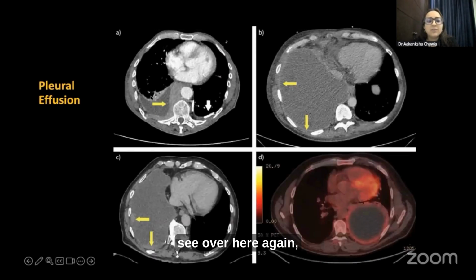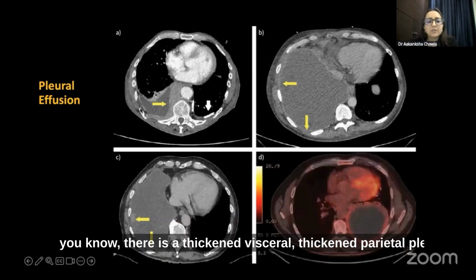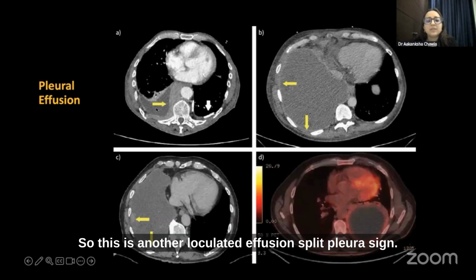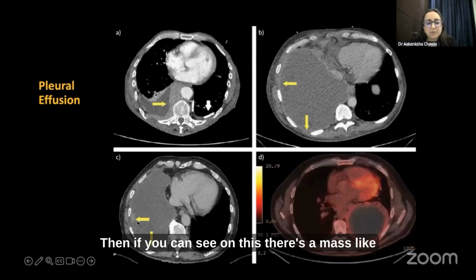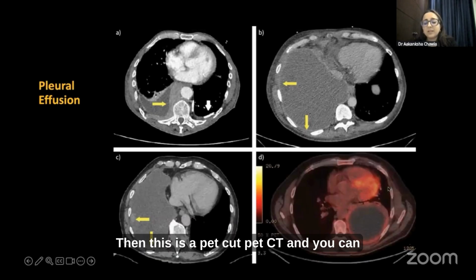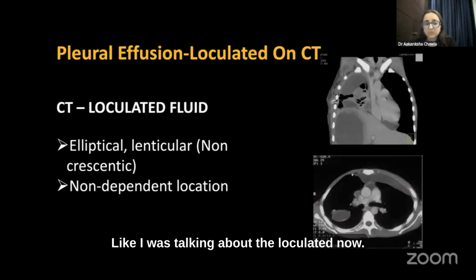Then some more axial cuts. If you can see over here, again, there is a thickened visceral and thickened parietal pleura, there's presence of a mass lesion, and there's fluid in between. So this is another loculated effusion, split pleura sign. Then on this one, there's a mass-like lesion in between. There are some nodular deposits, and there's a large effusion in this CT cut. Then this is a PET CT, and you can see an enhancing, well-defined effusion, which is loculated. It could be an empyema as well. So, different CT presentations, like I was talking about, the loculated.